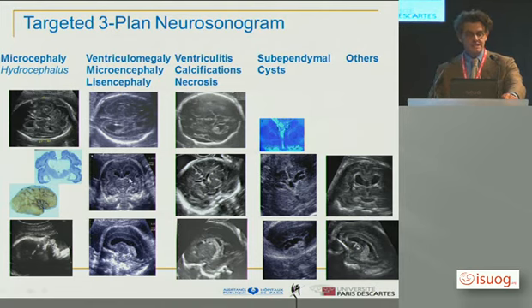What happens first is decreased growth of the brain, so not microcephaly, but microencephaly. And microencephaly will lead to microcephaly because the growth of the bones will not be stimulated by the growth of the brain. And what you will see, even in an axial view, is actually space around the brain. The pericerebral spaces will be large, although the baby is unlikely to be big. You will see the proximal hemisphere, although usually you don't see it because of this vacuum between the bones and the brain that shows you the proximal hemisphere.